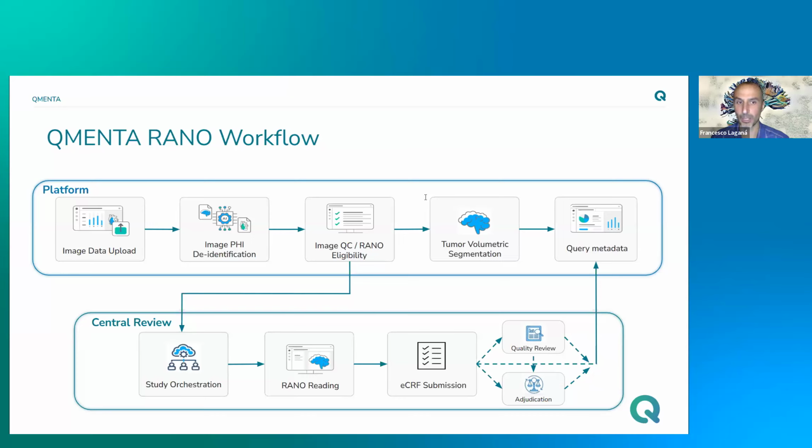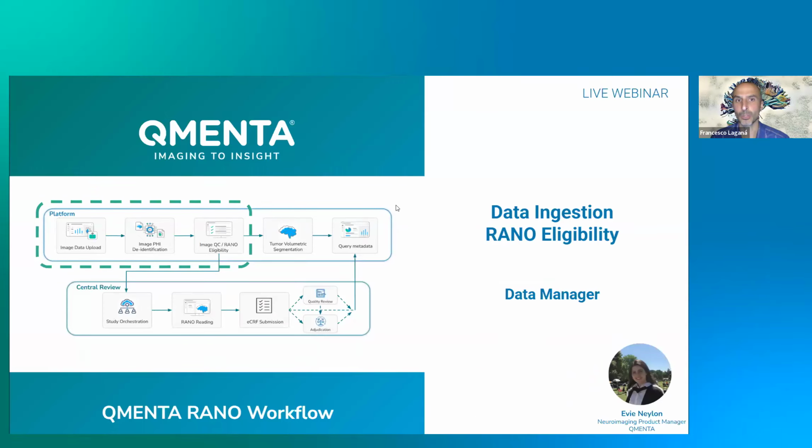You will not start from a blank page. QMENTA provides a pre-configured study environment, tuned precisely to clients' needs, allowing your study manager, reader, and data managers to be invited and be productive immediately. I'll now hand over to my colleague, Evie Neylon, who will begin the demonstration of a neuro-oncology study on RANO, starting from the very first step, data ingestion.